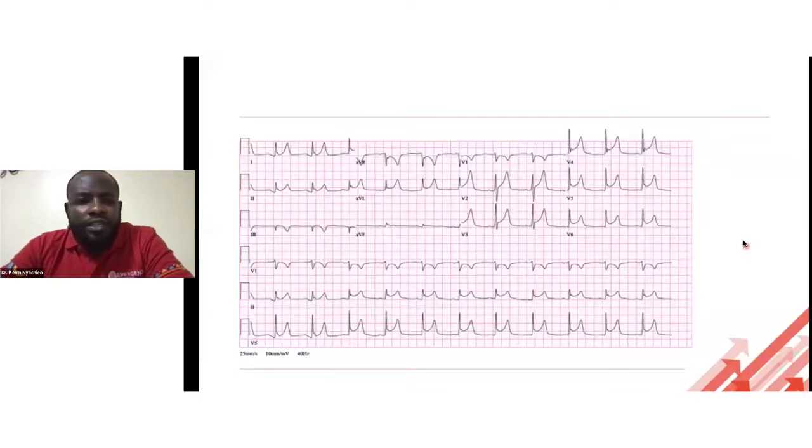Okay. In addition to this, when you look at the rate, sometimes you might find a sinus tachycardia, could be because of the pain. But when you do an ECG on these patients, you have widespread concave ST elevations. You have PR depressions, I think, in most of the limb leads as well.